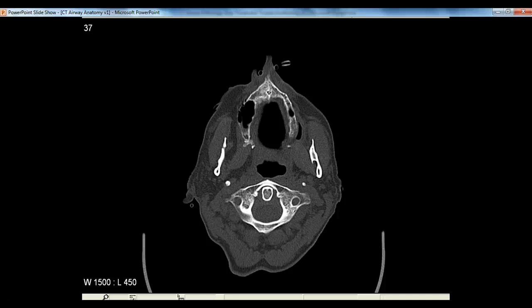Those two white lines on the side surrounded by the light gray is muscle. Those two white lines are the bones of your mandible or your jaw. They come down as thin structures like that, going superiorly to inferiorly, and then they'll make a 90-degree turn that we'll see. That 90-degree turn then is where the jaw comes forward.